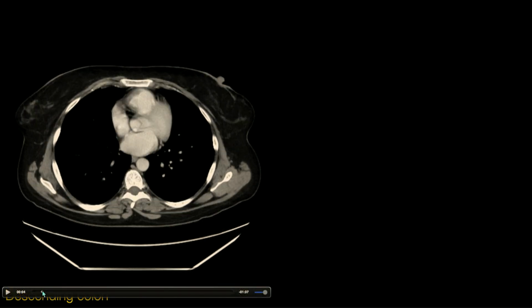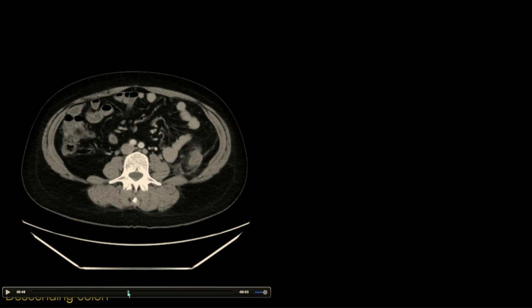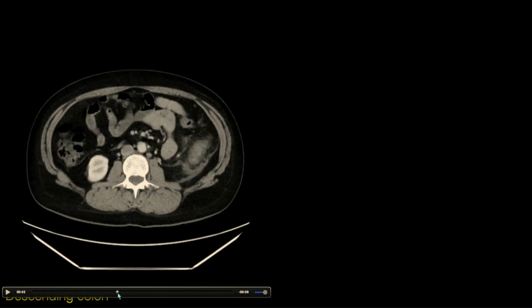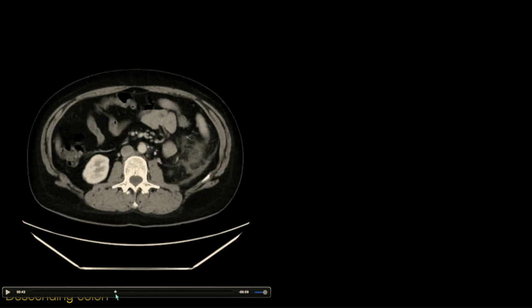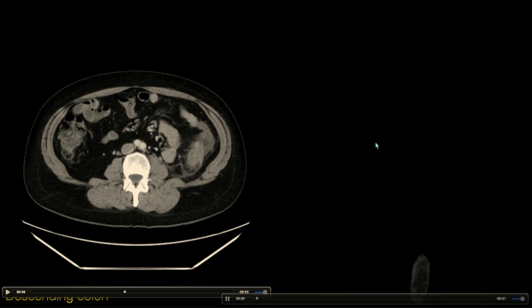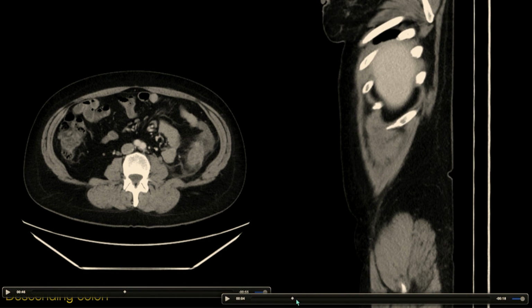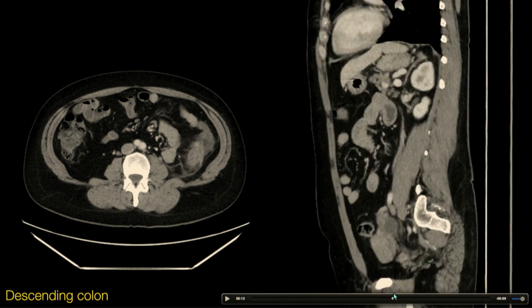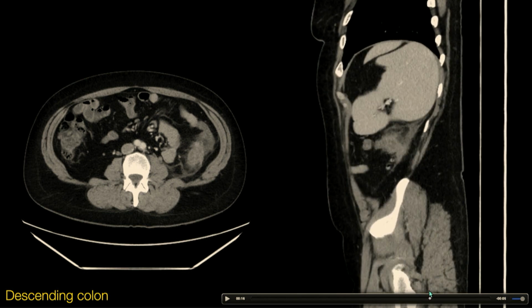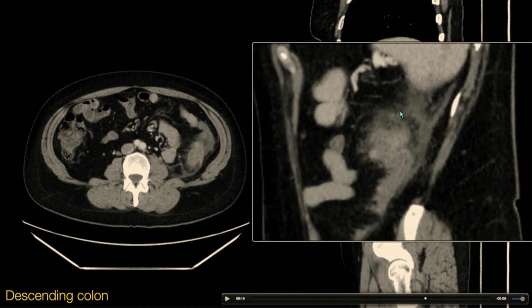When we get to the descending colon, this is probably where we're encountering our most common diverticula or cases of diverticulitis in our practice. Sometimes it can be a little hard when there's such robust inflammation to find the exact site. And you might start thinking to yourself, am I dealing with an infectious inflammatory colitis? Could this be an ischemic colitis? So just carefully look and evaluate that location for the culprit diverticulum. And in this case, it's this posterior projecting diverticulum where that epicenter of inflammation is.